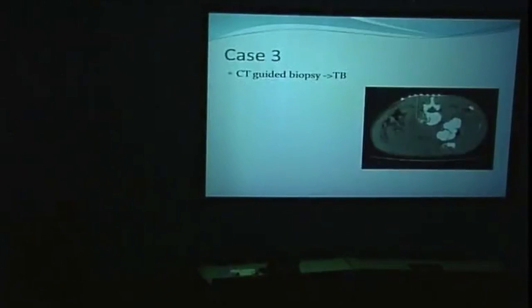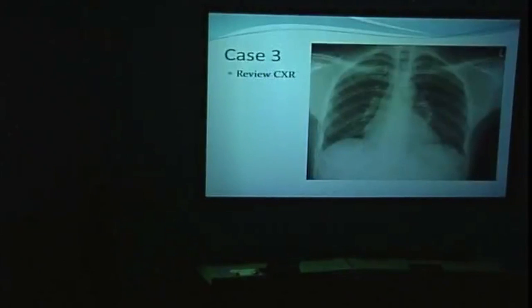Imaging is also very useful for guiding diagnostic aspiration or drainage. We usually don't really do much drainage of TB per se, unless it's causing pressure symptoms. It's usually enough just to get a bit out for diagnosis, and then once treatment commences, if it's sensitive, it melts away. You see how this is bone? Obviously the bone doesn't really grow back, but it does heal up by sclerosis.